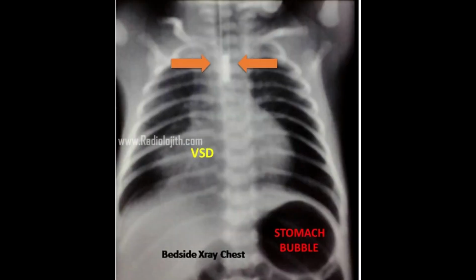X-ray chest shows a feeding tube with its tip at T3-T4 level and is suggestive of esophageal atresia. Stomach shows gaseous distension suggesting tracheoesophageal fistula. The heart looks odd with a bulge in the right paraspinal level, silhouetting the right heart border and the right diaphragm. Echo revealed a ventricular septal defect with dilated right heart.